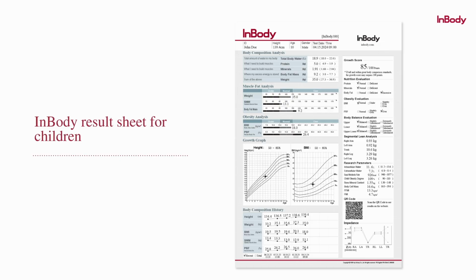InBody also provides result sheets which are specifically customized for the pediatric population. So instead of the segmental analysis, for the pediatric population, we provide growth charts, which are according to the CDC and WHO data. With this, we have completed the InBody 380 result sheet interpretation.